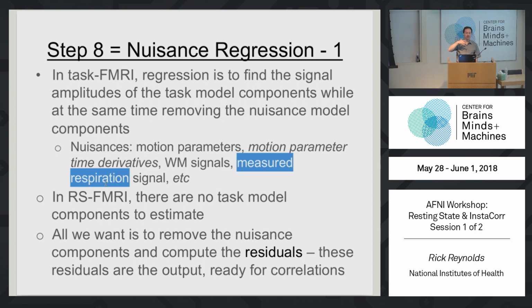We don't want blurring or anything like that. So the data is basically unmodified when you remove those slice-wise regressors, because they're trying to be very picky about the timing. The blood cycle is the fine-tuned part. The breathing, you wouldn't care. The breathing could be done at the very end. But if you want to be picky with the heart rate and stuff like that, then we try to do that early.